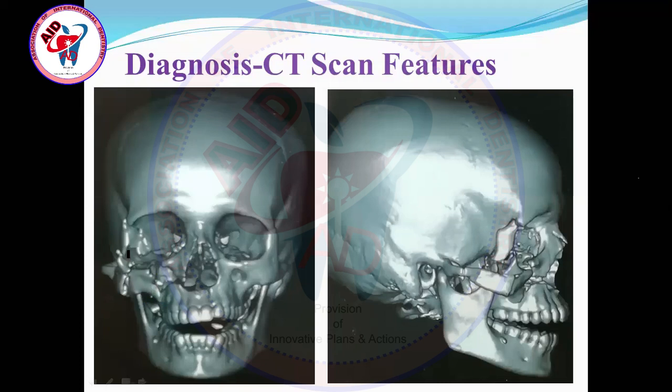has been fractured again in the body, and another fracture over there. Going posteriorly, at the junction of the body of zygoma with the zygomatic arch, there is a fracture, and this arch has gone outward. Why has it come outward? There could be some fracture more posteriorly also, and there is a fracture at the frontozygomatic suture. This is the frontozygomatic suture, and there is a fracture at the junction of this lateral wall with the body of the zygomatic bone.